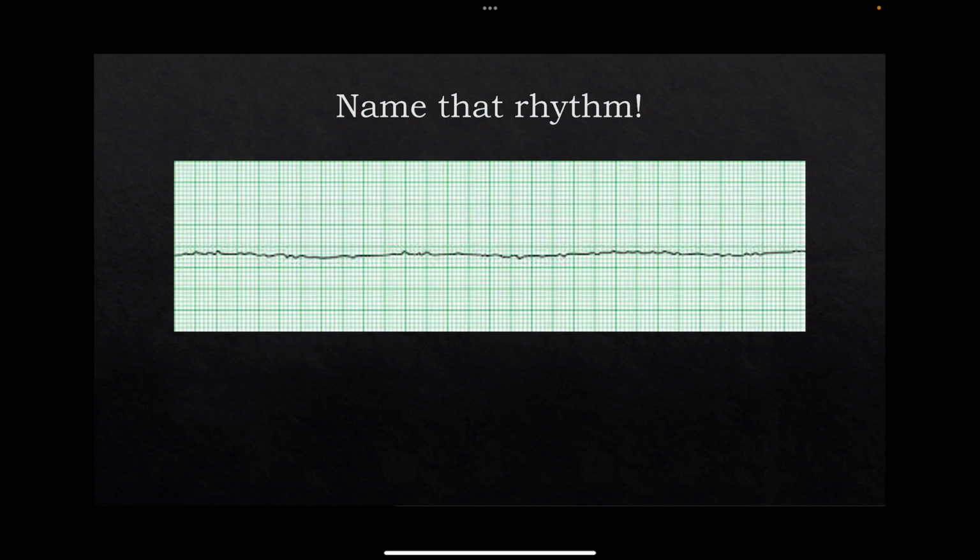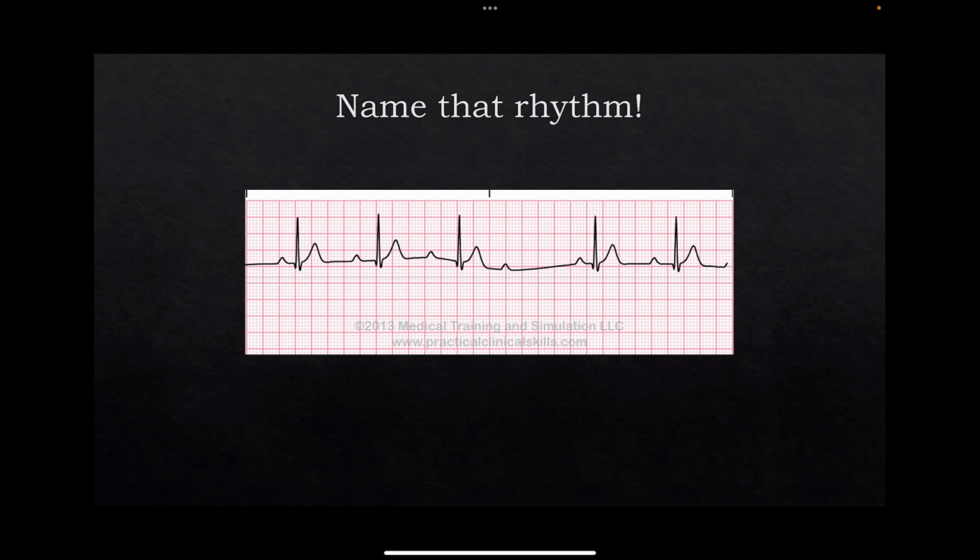Okay, what's this? Asystole, very good. Which one's this one? Do your interpretation, go step by step. Okay, so what's going on here? What jumps out at you? The PR interval, right? Does everyone see that PR interval? What's happening to it? Lengthen, lengthen, lengthen, drop. Then you have a Wenckebach, okay? Type 1. Okay, longer, longer, longer, drop. Everyone good?